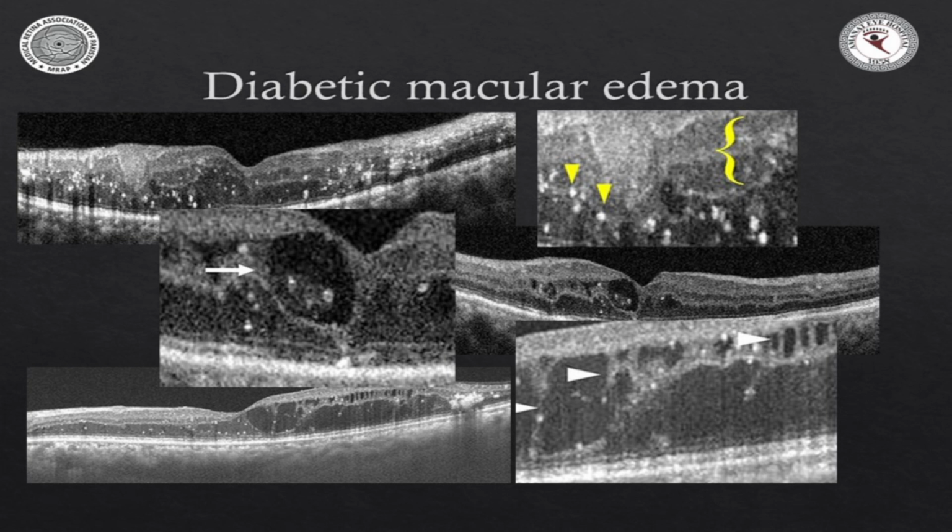Similarly, here, आप देखें कहीं पे outer retinal layers में break आ गई है, and at the same time, there's quite atrophy of the intervening septa between the cysts. So you can see that the cysts in this case and in this case are spanning almost all of the retinal layers. So this atrophy of intervening septa is actually atrophy of neuronal connections.